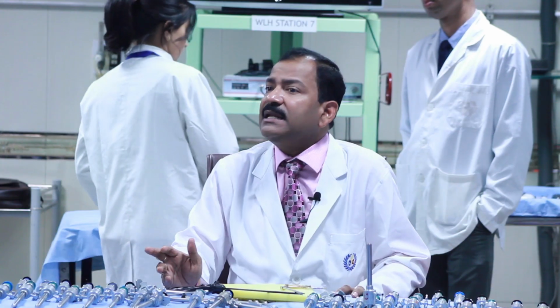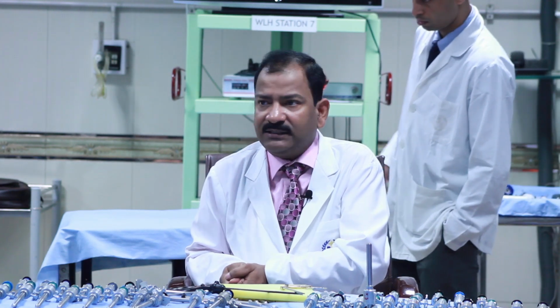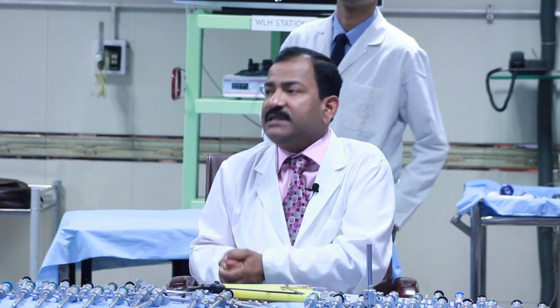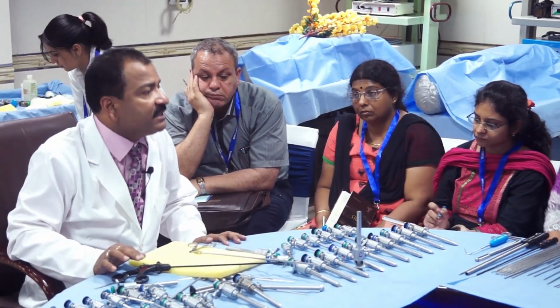And once you discuss it, then it is just like playing cricket. How you are holding the bat, how you stand, what your timing is, that depends on the player. This is the difference from player to player.